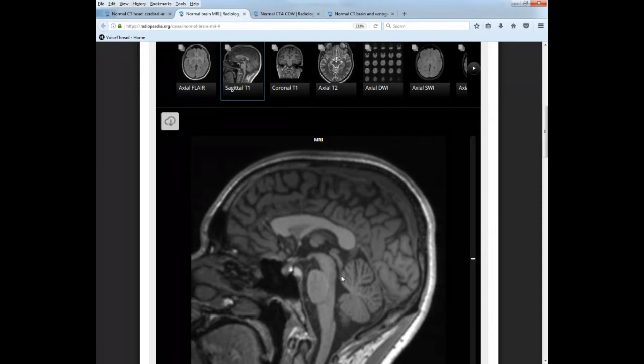If you are on a sagittal slice and you see the 4th ventricle, look just anterior to that. You're going to see this circular, enlarged area coming off the anterior portion of the brainstem. That's your pons. And just inferior to that, this guy right here is your medulla oblongata. Points to remember here: the tegmentum connects all 3.